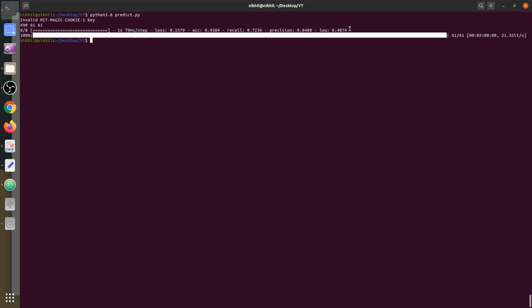Okay, the result is okay, it's not that bad. We haven't trained it much and we haven't tuned it that much. So you need to tune it according to you, because if I tune it and apply data augmentation here, it will take a whole lot of time. Okay, now let's see the images it has predicted.